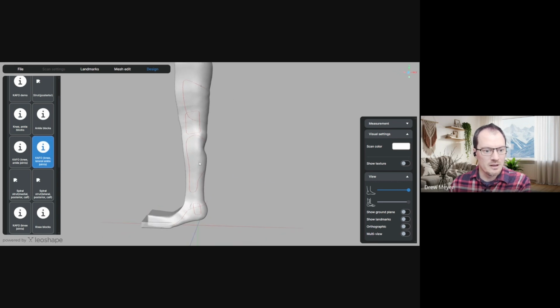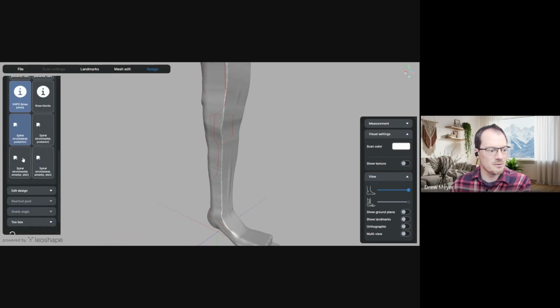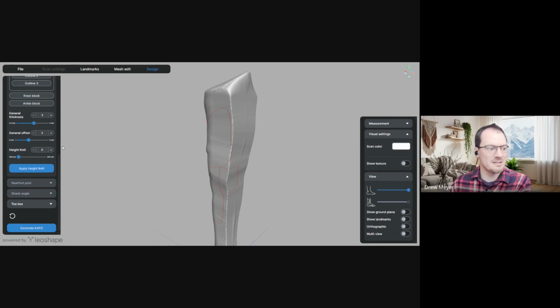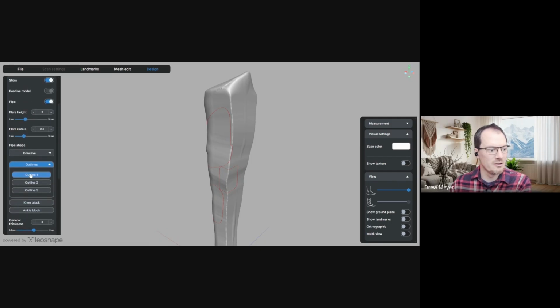Okay, so if I use a template like this, for example, what it will have available, and this is a beta thing, so bear with me, it's not completely ready, but it's ready enough. I wanted to show it off and get some feedback, put it out there into the world here.